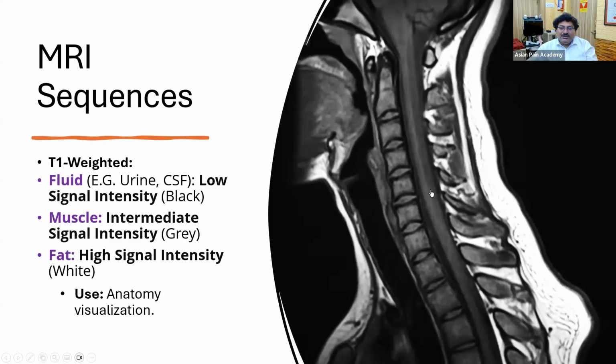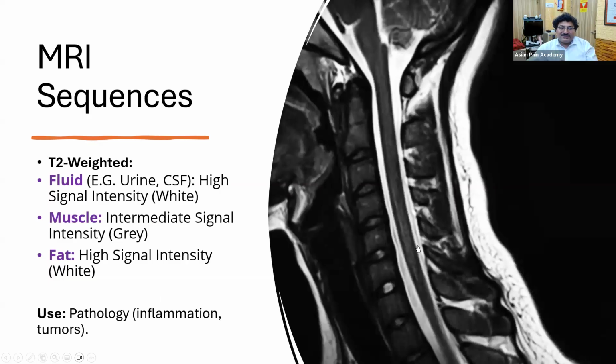This is important for finding bony structures. If there is any bony abnormality, we go for evaluation with the T1 weighted image. Suppose you can see a vertebra with marrow edema or a subvertebral compression fracture. In the T1 image, it will look more black, especially for fresh fractures. By seeing those, you can find the alignment and the bony abnormality in T1 weighted images.